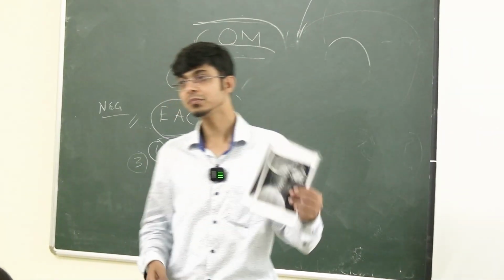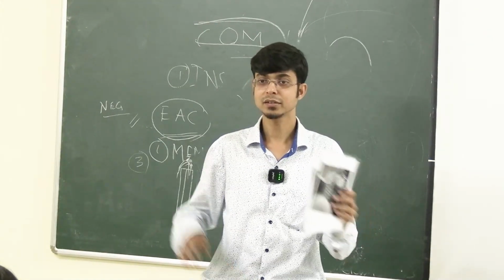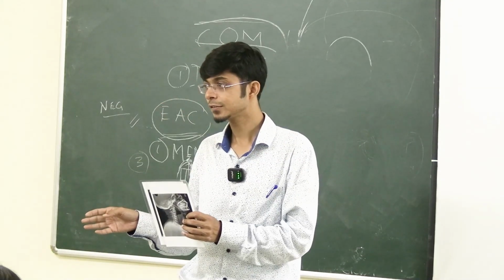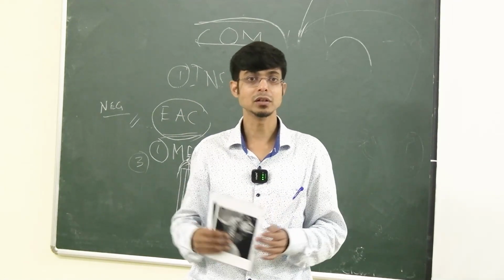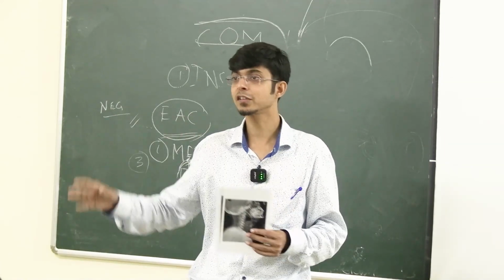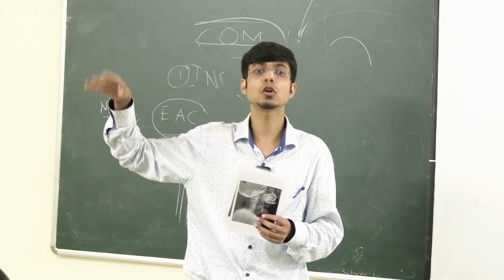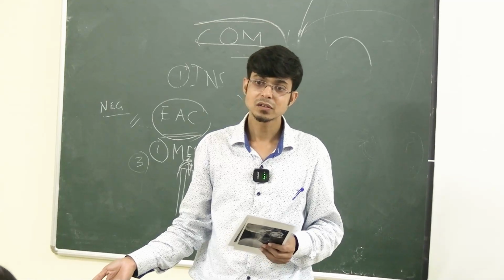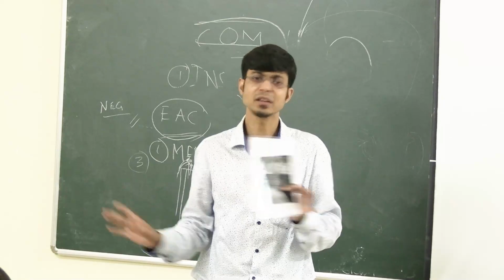So this is a skiagram of the soft tissue neck lateral view showing foreign body in the esophagus or showing a retropharyngeal abscess. Then the examiner will ask you at which age this is common, what are the causes of the retropharyngeal abscess. So you start with foreign body, go to infections, chronic infections, and gradually go on. Start with foreign body because that is one of the commonest causes. And the commonest cause in our country is tuberculosis. Okay, so your answer should have at least these two. Apart from that, there can be multiple other causes.